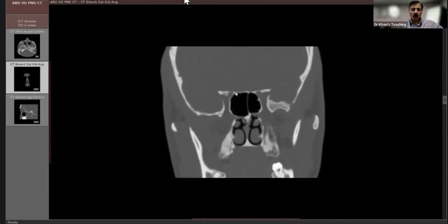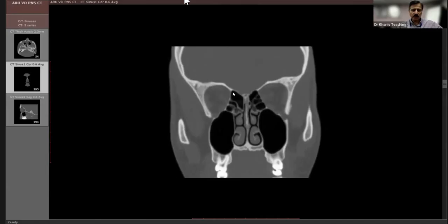Finally, all paranasal sinuses CT, please remember, are basically in bone window, right? So you have to ask your radiographers to send a normal soft tissue window also on PACS. And you have to evaluate that also. Otherwise, you are going to miss things.